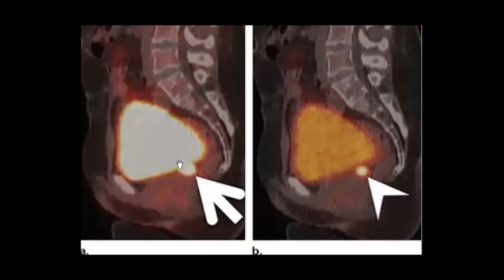If you look at this image, I will agree with you, Nermeen, that it will be a diverticulum because it's the same excretion like the bladder. But when they make this delayed image, maybe now there is a different uptake. So this means that if I told you that this patient has cancer, sigmoid cancer, then you can tell me that yes, it will be recurrence.